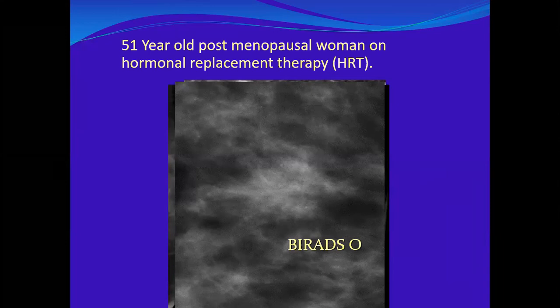Maybe just sort of sclerosing. The differential. Yes. Sclerosing adenitis or adenosis. Excellent. Complex sclerosing lesion. Excellent. This is, sclerosing can be a sclerosing adenosis.